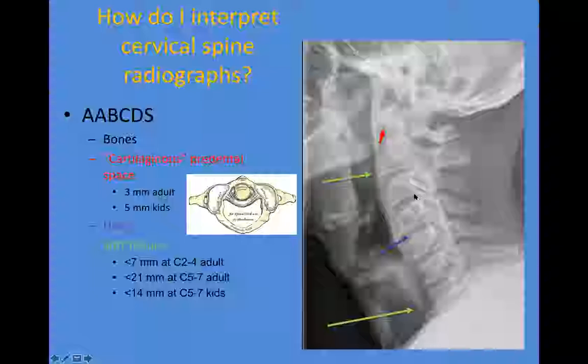Sometimes you will have certain things that are related to anatomy, like the posterior vertebral body is allowed to be a few millimeters taller than the front of the vertebral body, or C4-5, sometimes you'll see that it's a little bit less height than the other vertebral bodies. And those things are just part of physiologic variation. But by and large, what you're looking for is a symmetry in all of these rectangular shaped vertebral bodies and no step-offs along the lines.